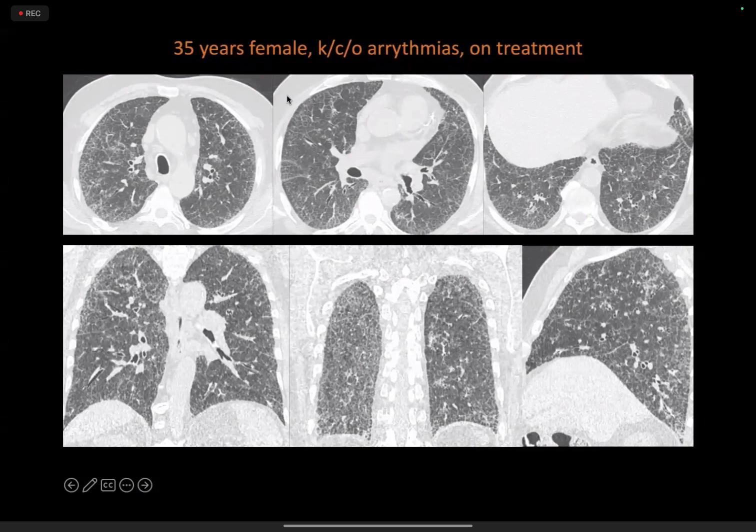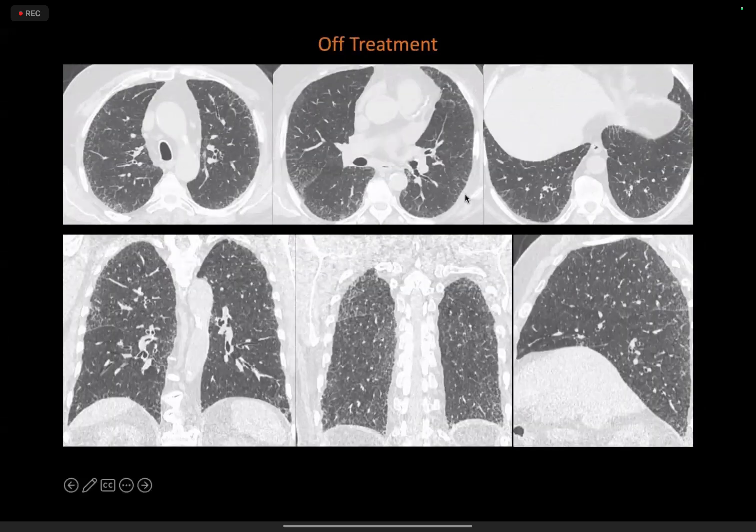So yeah, amiodarone. Remember, drug-related ILD, like I said, after CTD, drugs are another common cause for NSIP pattern. For that, you need to really ask the patient in detail because they might not feel it is important to mention the history of arrhythmia when a lung scan is being done. The importance is great because the moment you make this diagnosis, the patient will be asked to stop this drug. And typically, if that is the case, they usually show a good improvement.